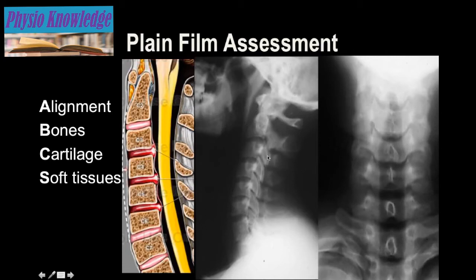We can see soft tissues or soft tissue swelling if it was present. Again, it's not very high sensitivity, but we still look in case there's something we can detect, either subtle or major, and that would present with changes on the soft tissues with the plain film.